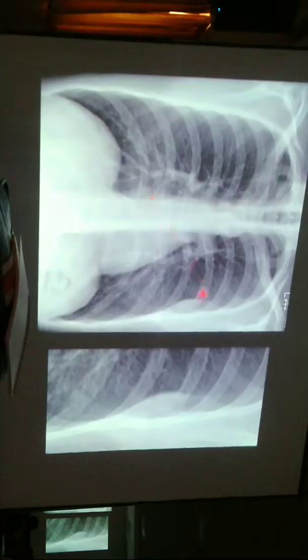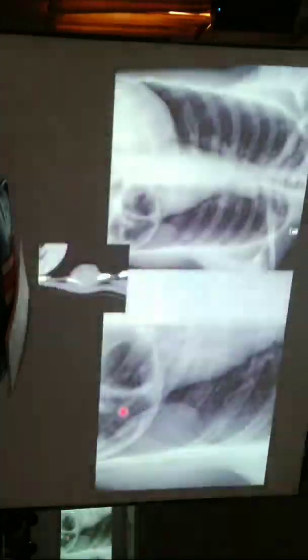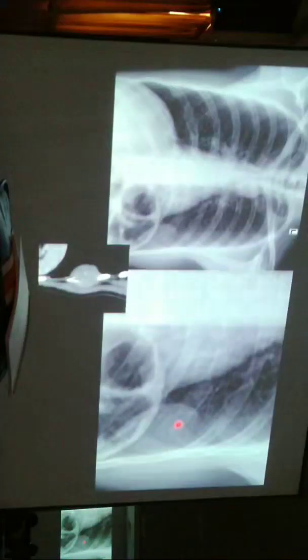What did we think of in this case? There's expansion. Cortex is preserved. This is FD. So you have a ground glass matrix with an orange peel type of ring-like periphery. This is fibrous dysplasia. What about this one? So, a companion case, similar location. What happened to the rib? The rib is destroyed. So this was METs.